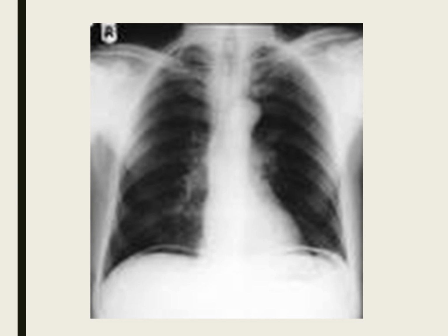So what about this X-ray? What do we see here? How's the airway? It's all fuzzy. Airway looks pretty much midline. Bones are fine. Heart looks pretty much normal size. Aortic arch, no big hilar areas. The diaphragms, they look nice and straight on both sides.